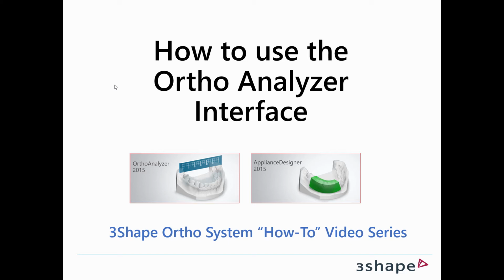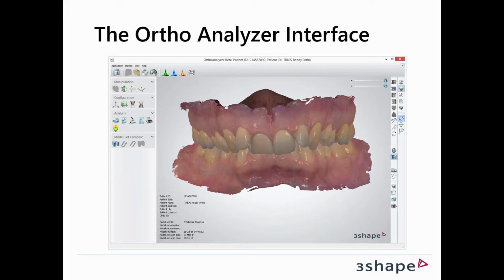Welcome to this how to use the Ortho Analyzer interface training video. So what do I mean when I refer to the interface? Well, as you can see on the screen here, I have a screenshot of the main Ortho Analyzer interface. And I'll be referring in the training video to 4 distinct areas of this interface.